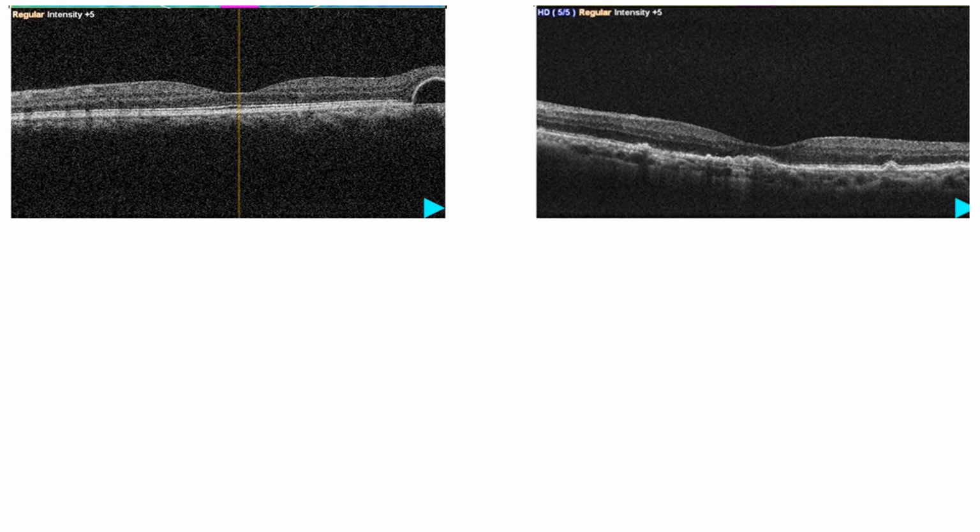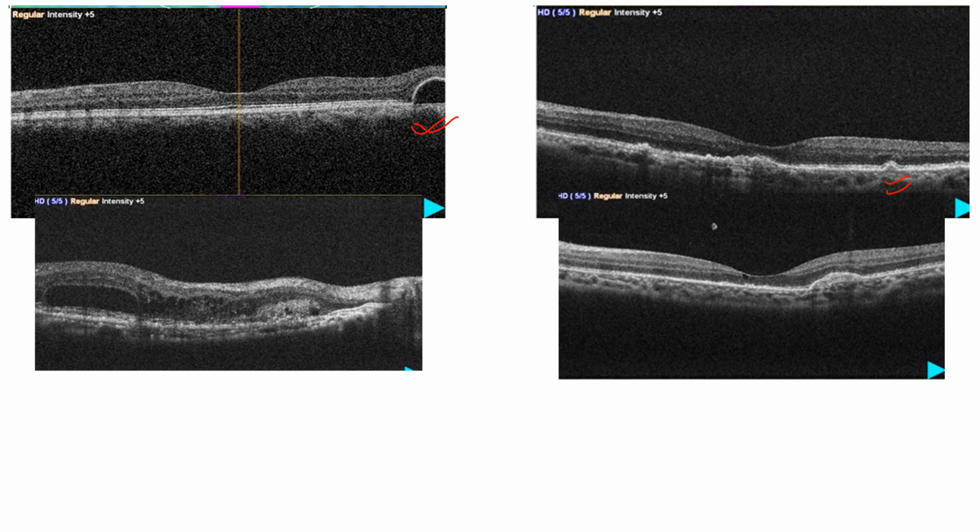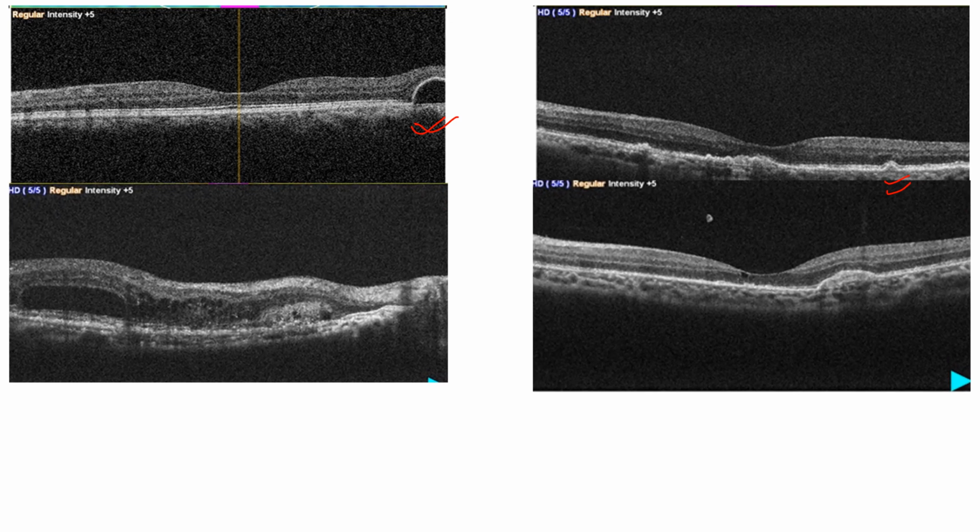So now coming back to our starting point and reassessing if we can judge these images correctly after going through this slideshow. This is retinal pigment epithelium detached from the underlying Bruch's membrane, and here we have drusen, where we have solid deposits between the Bruch's membrane and the retinal pigment epithelium. Here we have hyperreflective subretinal deposits as seen in ARMD, and here we have a scar formation with no presence of fluid or any inflammatory sign.